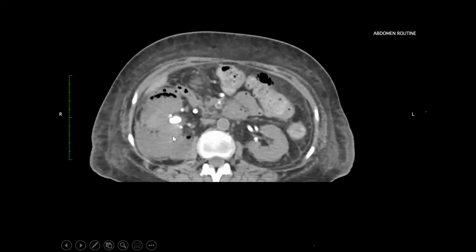But here on the right side, there is gross deformity of the kidney. There is an obstructive calculus in the renal pelvis, and the renal outline is poorly defined. There are gross inflammatory changes and the presence of air because of emphysematous pyelonephritis in this example where the renal pelvis is obstructed. These patients can at times also show xanthogranulomatous changes, in such obstructed kidneys where long-standing obstruction is there. So presence of air in a kidney, always suspect emphysematous pyelonephritis, as shown here in this image.